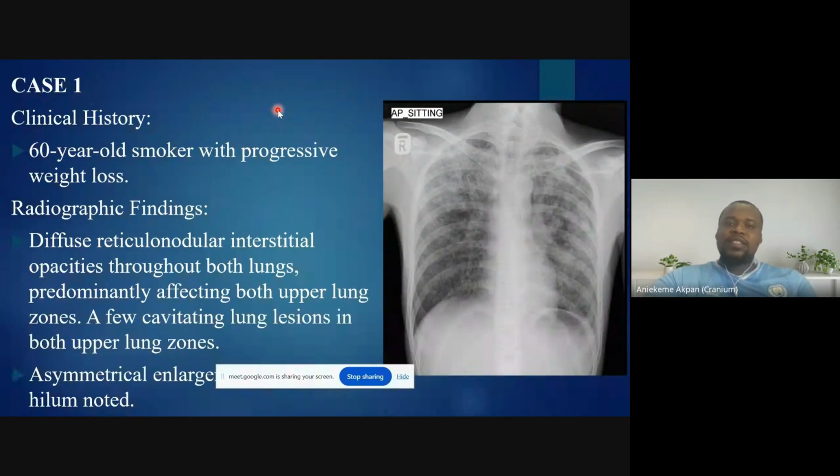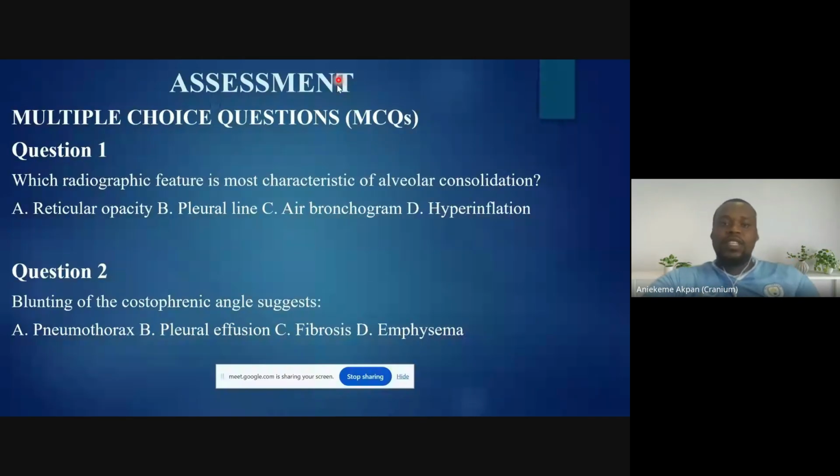The chest X-ray is more for assessing the TB, because sometimes they can do a blood serology test and know if this person has TB or not. But most of the time when they send them for X-ray, they want to know how badly it has destroyed the lungs. They can easily do a blood test and know that this person has tuberculosis. So the effect on the lungs is mostly why they send them for chest X-ray, and to see if there's any other possible cause.